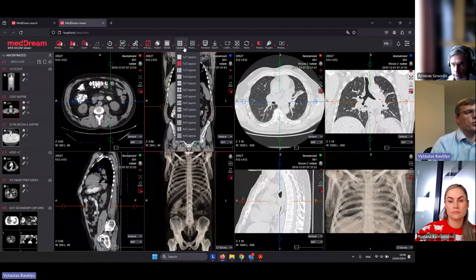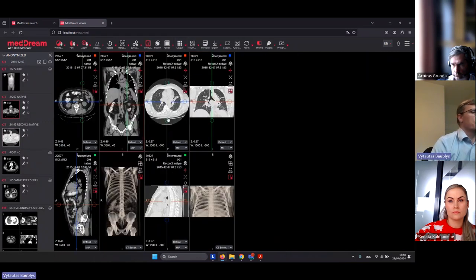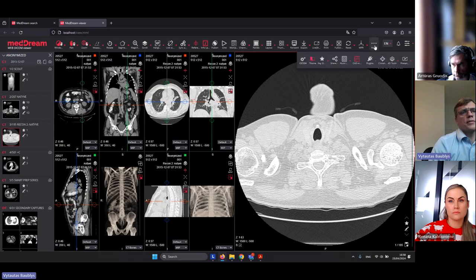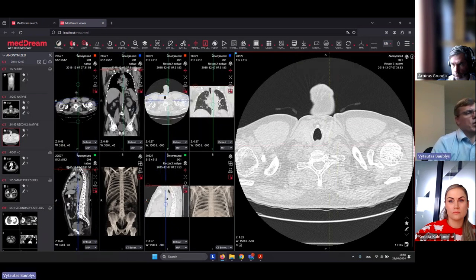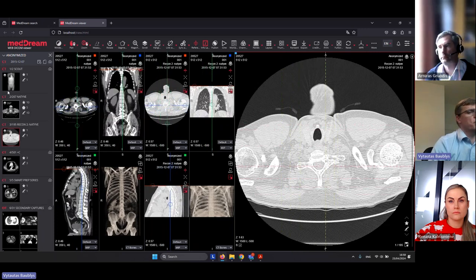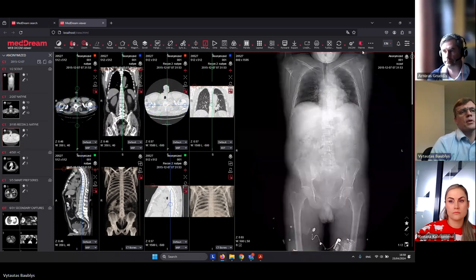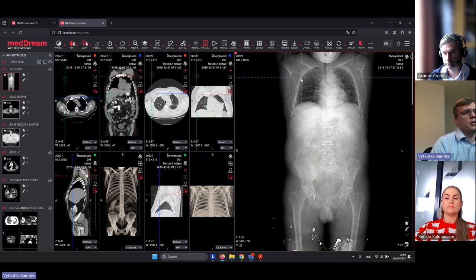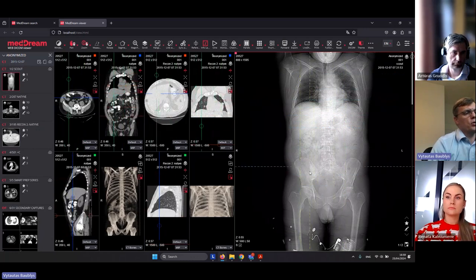But if I change the layout to a different layout, like 3 images, and I put one extra image from here, and I use the crosshair here, now it's propagated between all three views. So for example, if I drop like this, and I select the crosshair layout, now I can scroll through the whole body, landing on exact points on the MPR view.